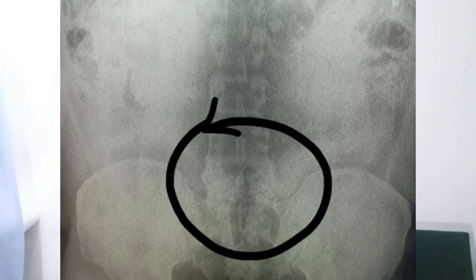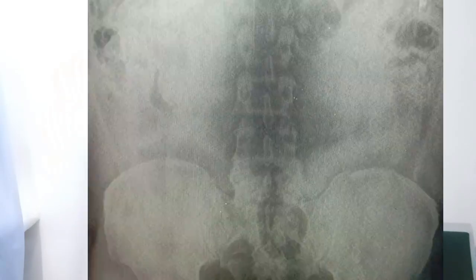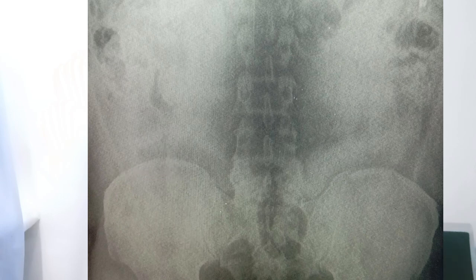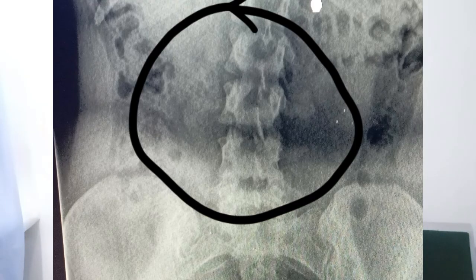later in the future. Now, the second X-ray, looking at it also, you can see that the person has the same issue, where there is also reduced joint space in that particular part, which means the person might also be having pain, just like I mentioned in the first one. Now, before I forget, for the first person, if you check properly, you see that the spine, first of all, is not aligned.